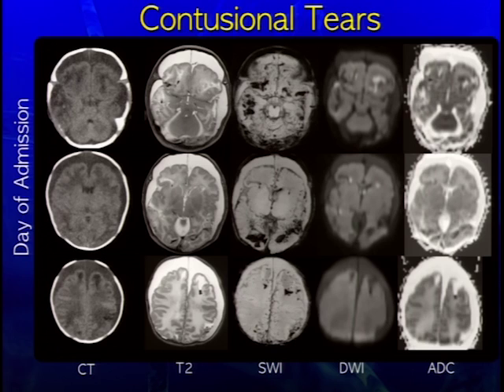And in conjunction, you see those extraaxial collections, the subdural collections that Gary mentioned earlier, that are hygromas, predominantly CSF in signal intensity, with just a little, most of the blood products being in the adjacent subarachnoid space.